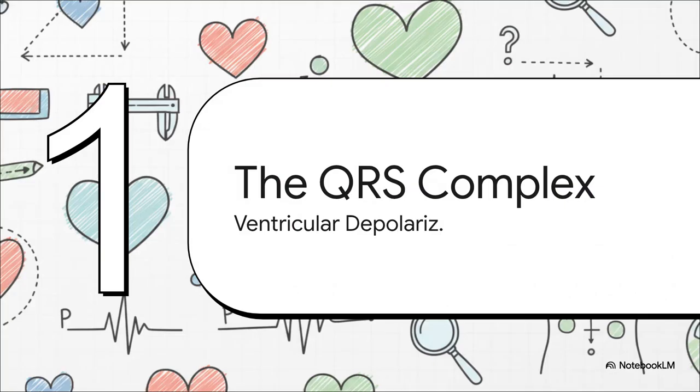Our next point of focus is the most obvious, most prominent feature on the ECG, the QRS complex. This series of really rapid deflections is the electrical signature of ventricular depolarization. It's that massive, coordinated wave of electricity that triggers the powerful contraction of the heart's main pumping chambers.